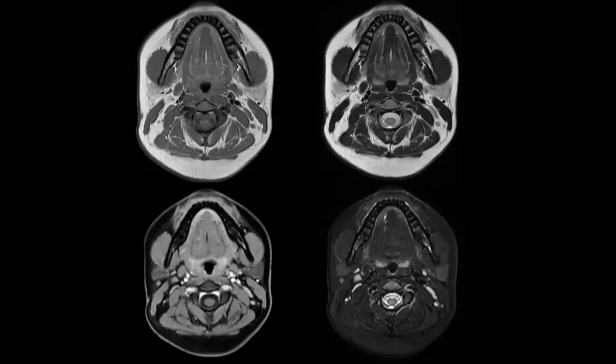So, imaging anatomy of the tongue. Since we use MRI, I will first briefly speak about the sequences, just a summary of which is what sequence. So this is T1 weighted, T2 weighted, T1 post contrast, STIR images. These are the major sequences that we use in tongue imaging. Now, T1 weighted, we can see CSF is hypointense. T2, CSF is hyper. STIR, CSF is hyper. And again, T1 post contrast, CSF is hypo. So I have established that these are T1 sequences.